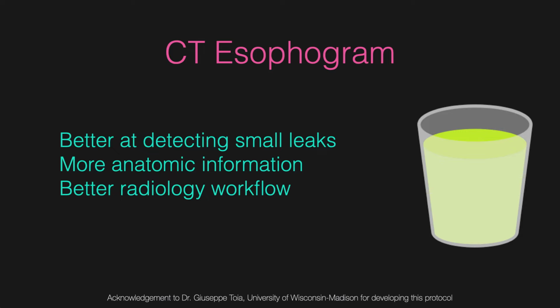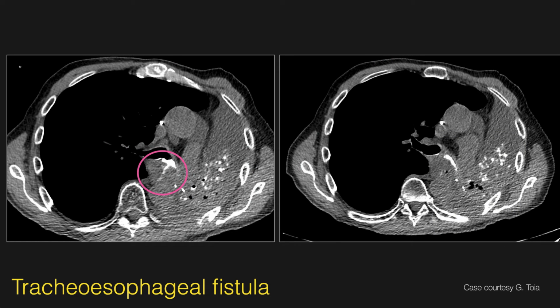This study is better at detecting small leaks, gives us more information about the nature of the leak, and helps keep our workflow more efficient during daytime and after hours. Let's take a look at some other examples of a CT esophagram.